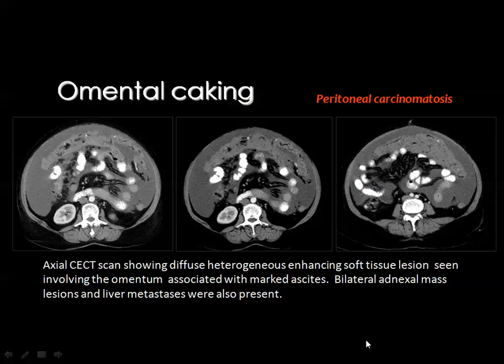And this is a frequent finding in clinical practice, which is known as the omental cake, where you can see a sheet of soft tissue mass infiltrating the greater omentum, lying immediately posterior to the anterior abdominal wall, and the mass is of non-uniform CT density. There are, of course, some linear fat streaks of the omental tissue, and in most cases, you see a big amount of ascites.